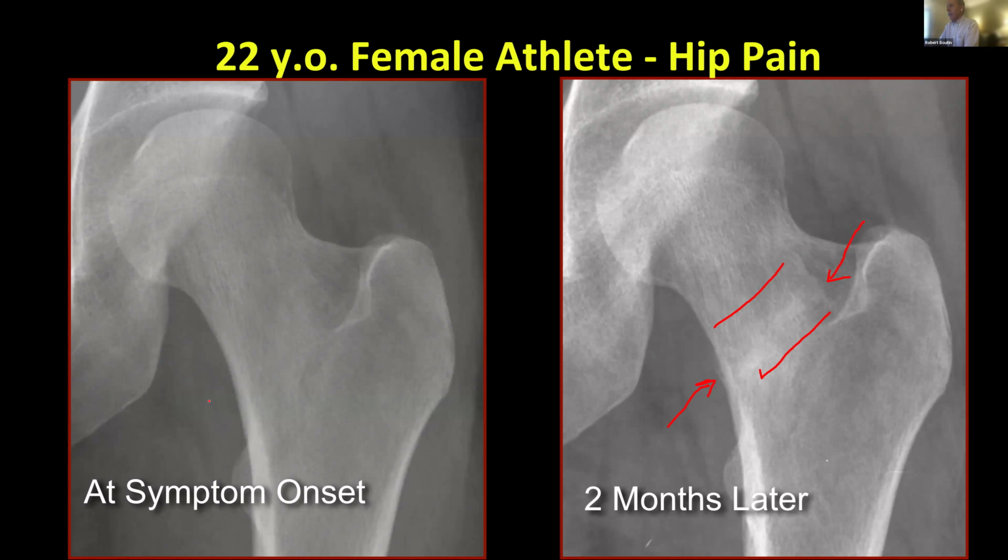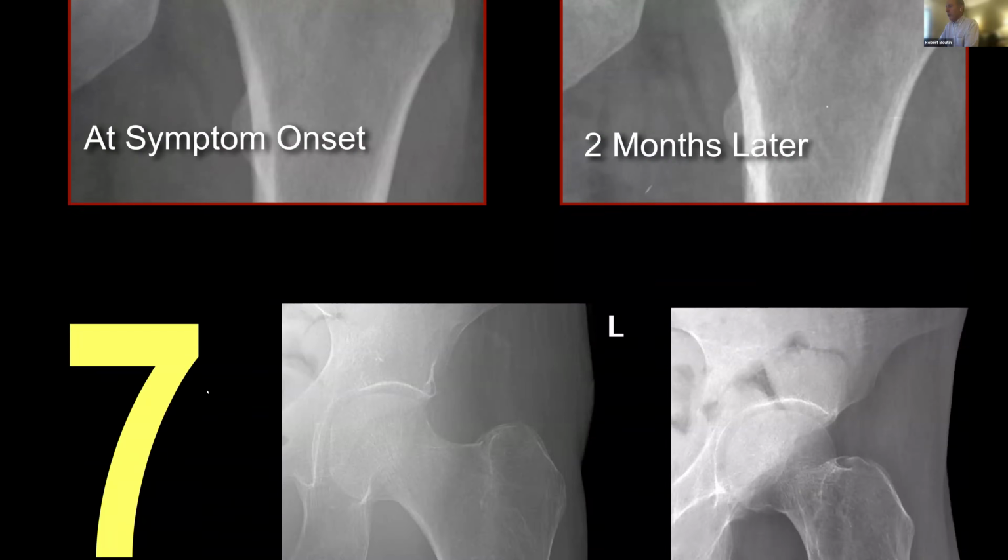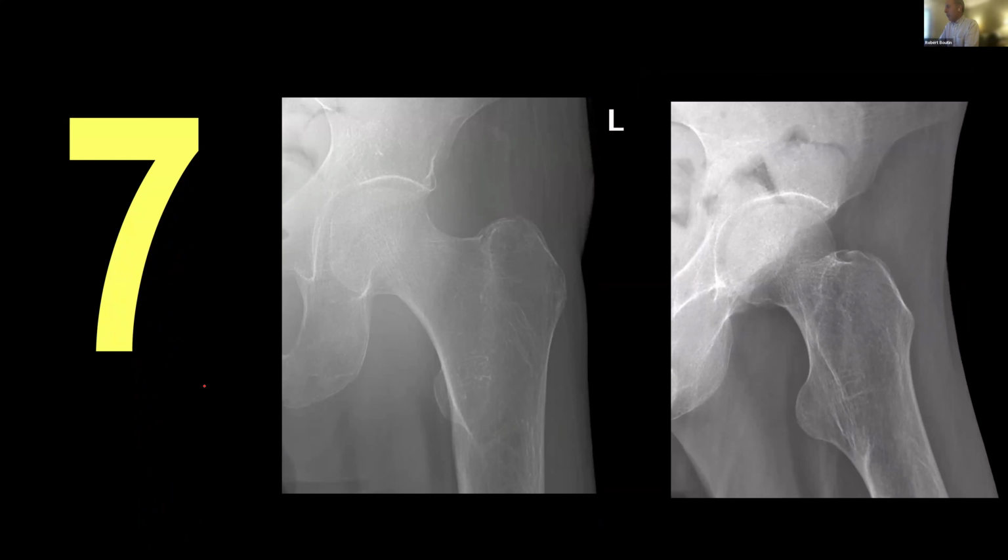This for sure is another stress fracture and was followed up with an MRI. Of course, when they're touching the medial cortex and are deemed compressive, often they can be treated non-operatively, but if they go all the way across or on the tensile side, surgeons like to be more aggressive.